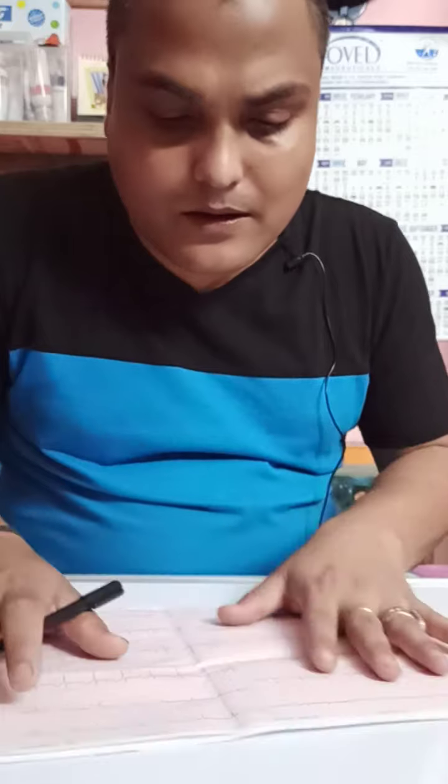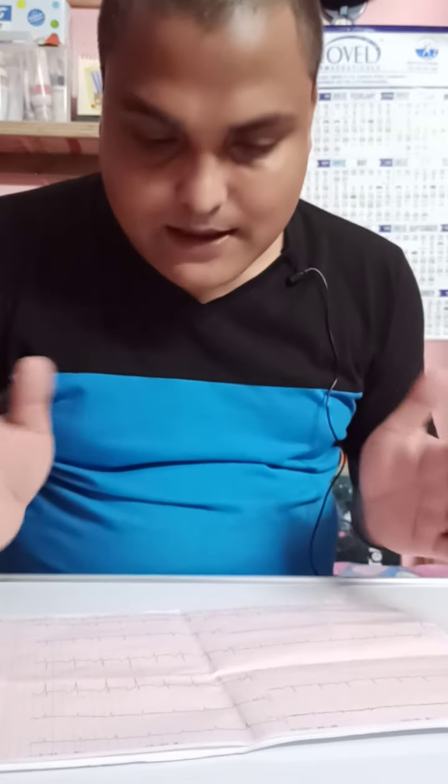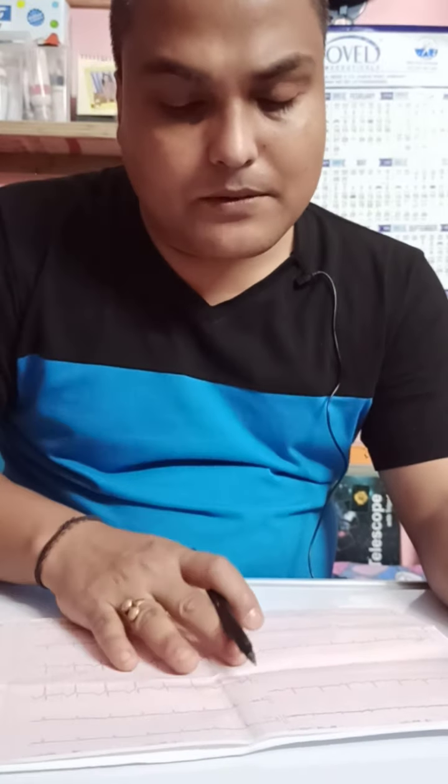In the exam it will be given exactly like this. You know there are 12 leads that I have explained to you. After giving this, the question will be asked, what is this?